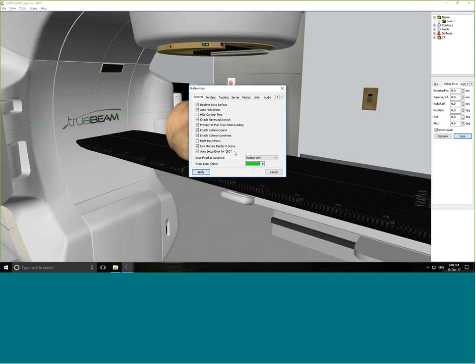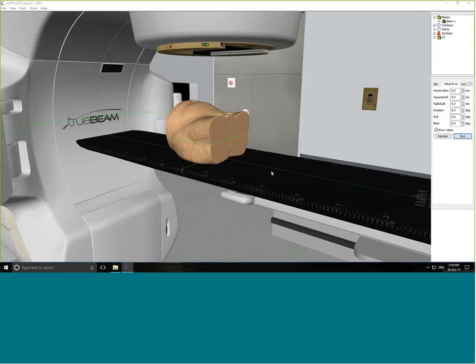There's a couple of pros and cons for this. So you have a random error, which you'd probably expect to see in the clinic. Or if you're wanting to use it as an assessment tool, then you can manually put the error in here, and this way you can assess the competence of the match.